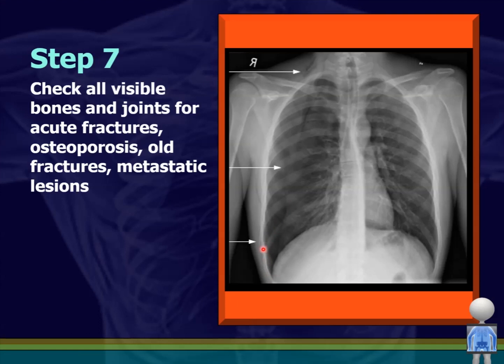That's not a straight line. Look at that. There's a little piece broken off. Oh. So remember, look at all your bones. You're saying, is there a straight line here? If it's a fracture like the picture I just showed you with the clavicle, you don't even need an x-ray to figure that out, right? You're not going to miss that.